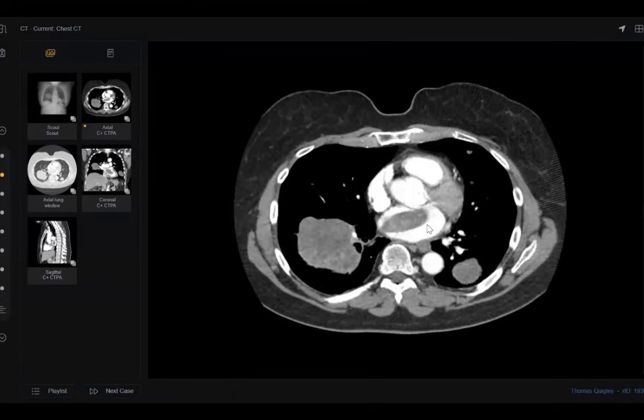I have a question. Usually, I have observed that for bland thrombus, we give the critical alert because these are treated by anticoagulation. But for tumor thrombus, we do not give the alert because it is a tumor which needs to be surgically resected and cannot be anticoagulated. At least, in my opinion, as radiologists we should mention there is a red flag here.